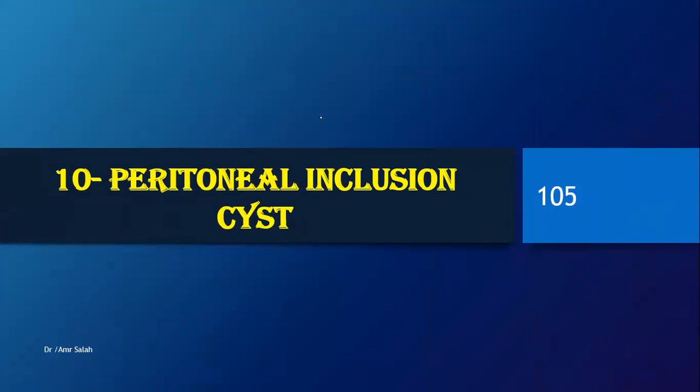So now we have discussed the tumors, the PCO appearance and the PCO syndrome, the stimulated ovary, and the ovarian apoplexy, the ruptured ovarian cyst. Remember, the patient that's having an acute abdomen and free fluid in her abdomen and an abnormal looking cyst in her ovary. All right, so this is the ovarian apoplexy or the ruptured ovarian cyst and the para-ovarian cyst.